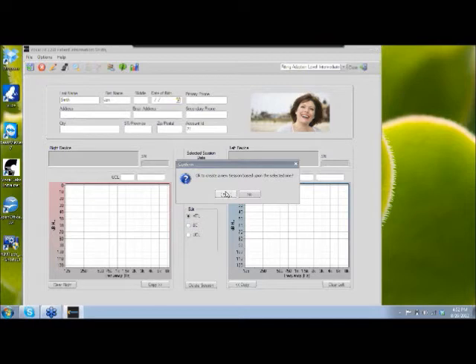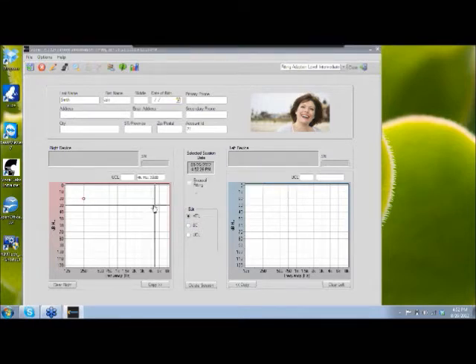Every time you go to begin, it's going to ask you if it's okay to create a new session. Say yes to that. When you press down on your left mouse button, it will drop the marking down on the audiogram for you, and you'll see that it's referenced in this box up here exactly what frequency and what decibel level you're on. Makes it a little easier than paying attention to the graph sometimes.